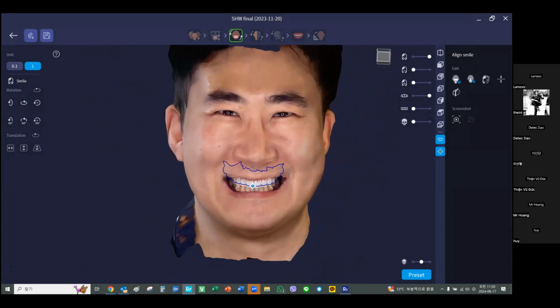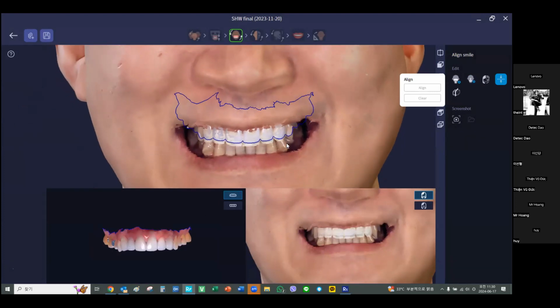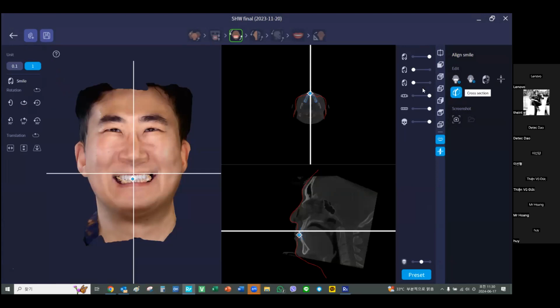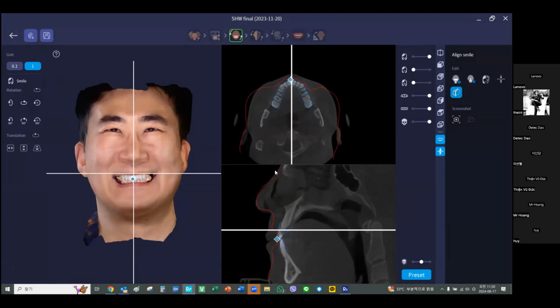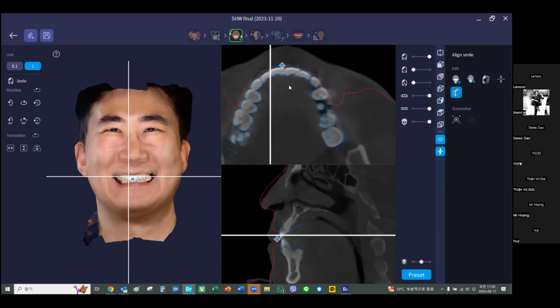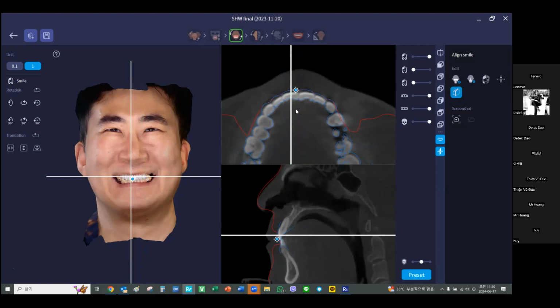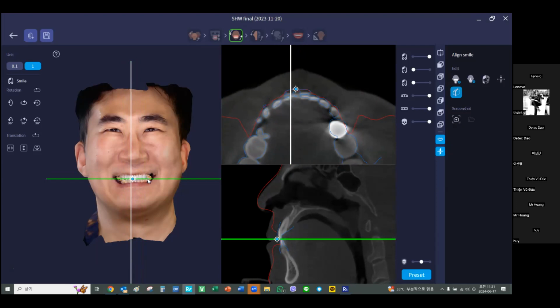And also you can check in the Align tab. Also, you can have the manual matching by 3-point. Or you can check the cross-section view. Forget about the reorientation, it will be done again. So when you move the bar, you can see the matching. You can highlight. You can zoom in. The blue line is the outline of the intraoral scanner. And the red line is the outline of the facial scan. So when you move the bar, you can check it.